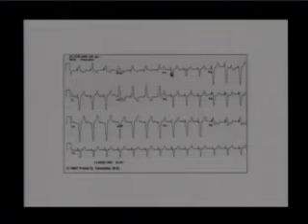This would be a ventricular pacemaker, and you can see that the line or spike that represents the electrical activity of the pacemaker is before the QRS. So if the patient had a ventricular pacemaker, the spike on the ECG would be before the QRS.